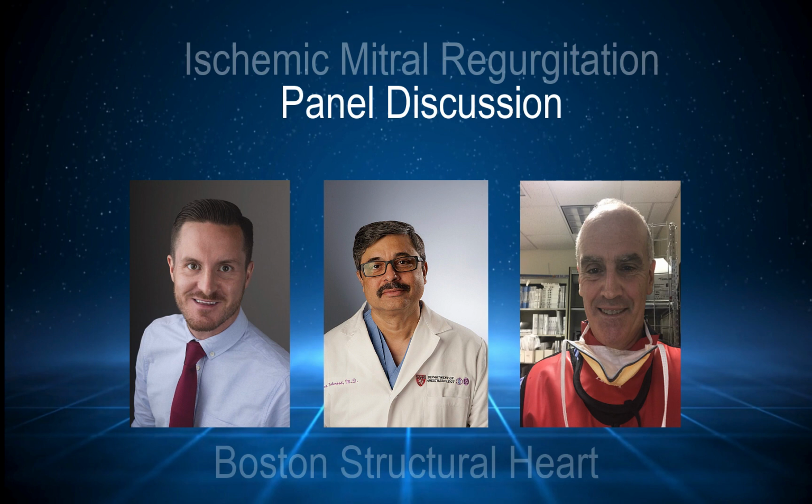I think as things become more automated, it'd probably be easier to do all of them. If you said, hey, Andy, what do you do in your practice? I would look at this valve, and the first thing I would measure would be the tenting height. One question is, where do you measure the tenting height from? Four-chamber view, long-axis view. But if that tenting height in both views was well more than a centimeter, then right away I'd say that the valve has been remodeled and it's been chronic like this for quite some time.